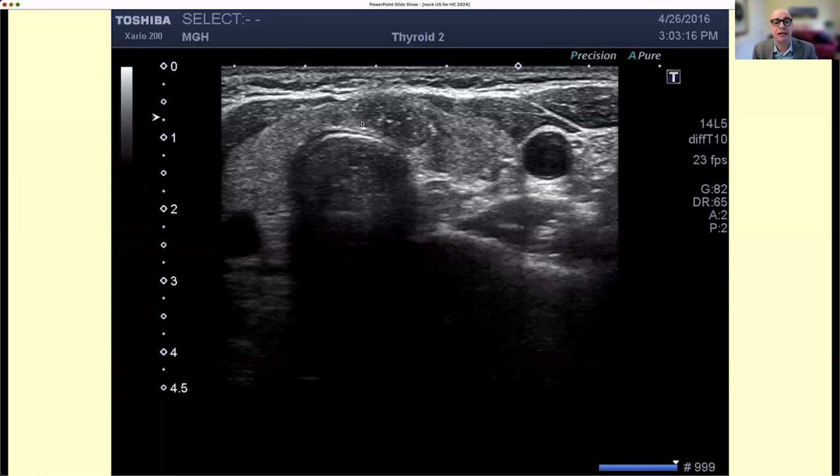Some people will say, well, if you're not sure that it is intrathyroidal, you'll biopsy these even if they're very small. The unfortunate thing is that in the isthmus, like this nodule, they're always going to be like that, just because the isthmus is thin. Any nodule will almost immediately reach the trachea and the anterior capsule. So many nodules will look like this without necessarily being cancerous.